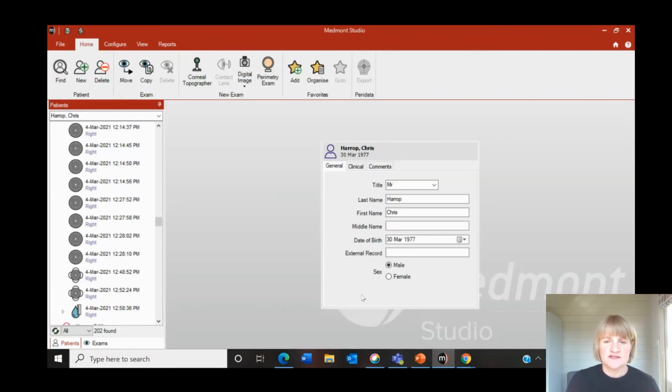So you can see that there's a great deal of flexibility in there to change the parameters. You can select a different trial lens and see what that would look like on that patient's eye. You can make the changes that you would be making empirically in your order and see what effect they have on that cornea. This certainly doesn't replace putting a trial lens on eye, but it really does help you understand the consequences of the fitting changes that you make, better choices for your first lens and better choices when you go to place your order.